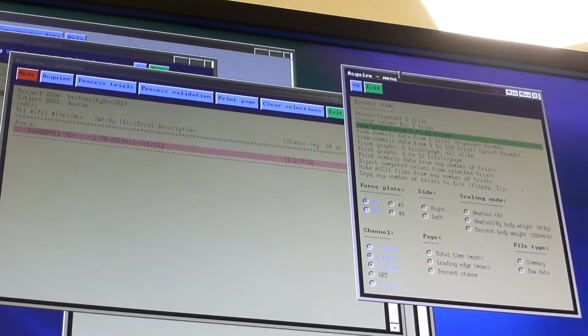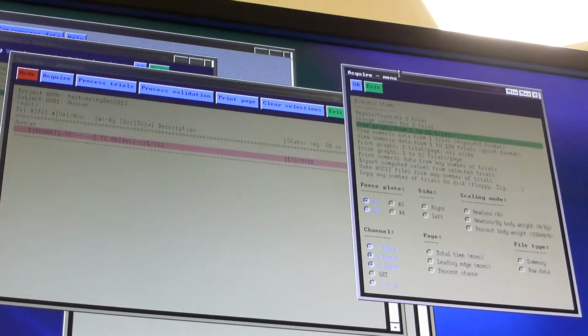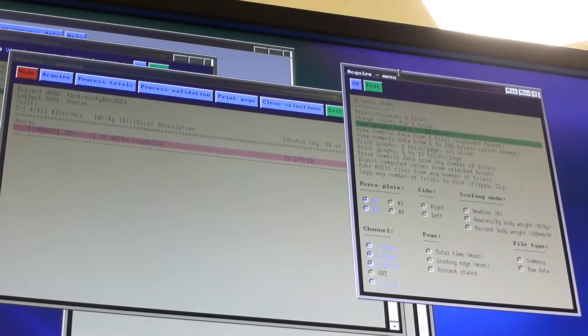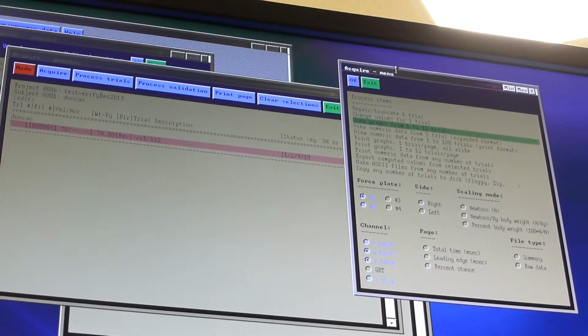Yep. Okay. But when you look at the two graphs overlaid, it's going to appear that the animal always went the same direction. And so that can get a little confusing. It's very helpful for doing the comparisons. But when you enter that notation, you don't want to be deceived by that. Just always use the physical plate number. Okay.